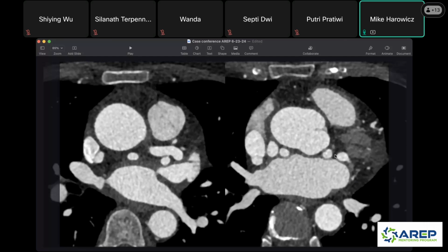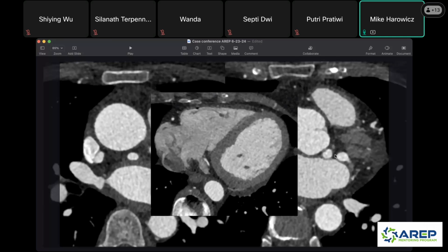So when you see big coronary arteries, I'm already thinking something's wrong, right? Especially when they're diffusely big. And so the first thing that I think of when I see that is, is there a fistula somewhere? So let's trace out this person's coronaries.